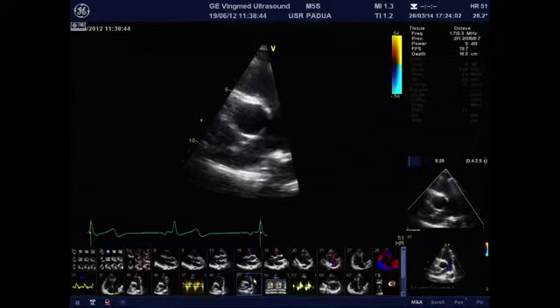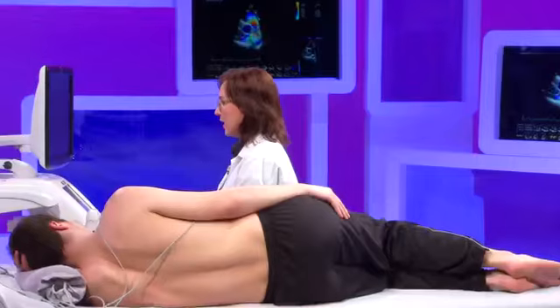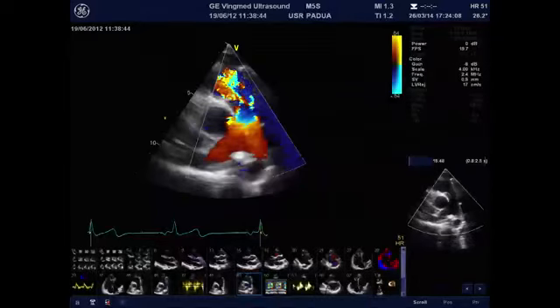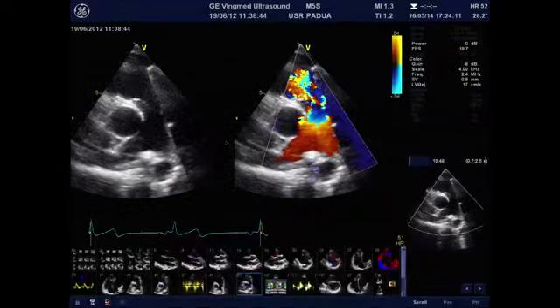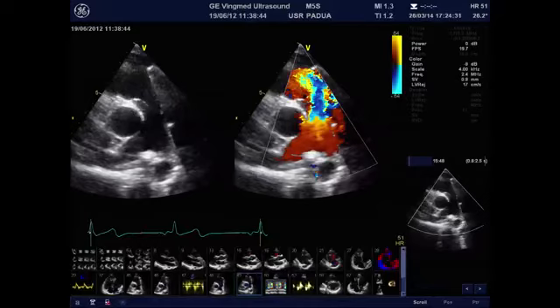Then you can appreciate, by performing the ratio between the right ventricular outflow tract and the thickness of the vena contracta, if the ratio exceeds 0.65, it is indicative of severe pulmonary regurgitation. There is no defined cutoff for the absolute thickness of the vena contracta in pulmonary regurgitation, but just this parameter of the ratio with the right ventricular outflow tract.